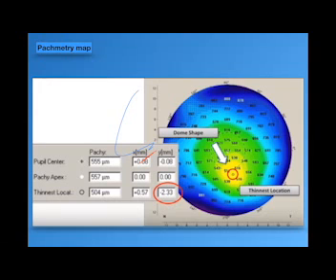The vertical deviation is more important than the horizontal deviation, because the behavior of the cornea is inferior, especially inferonasal, in keratoconus. So the inferior or the vertical deviation is more important to consider than the horizontal or the superior deviation.